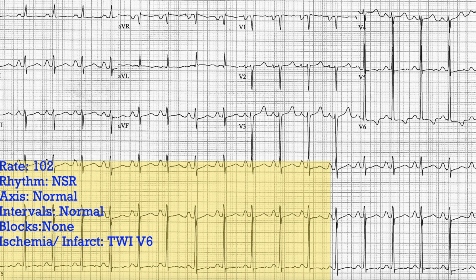So the most obvious pattern is that thing that we see here, these giant QRS complexes. What do you think of when you see big QRS complexes? Well, usually we're taught that that's left ventricular hypertrophy, or LVH, which is probably the case in this person. Again, I don't know any clinical history. This is just an EKG that we found. But this is a good example of a QRS complex reaching up and touching the complex above it.